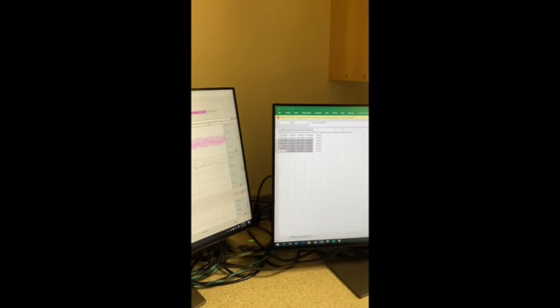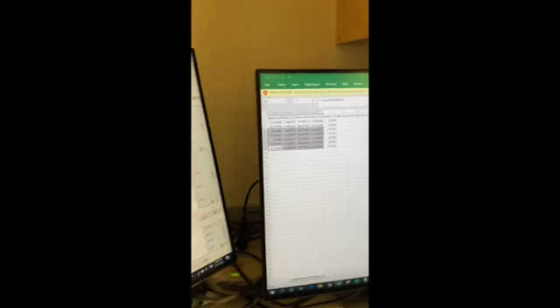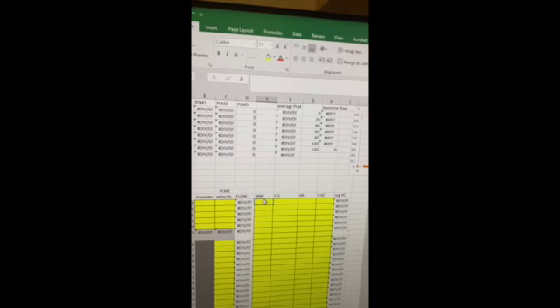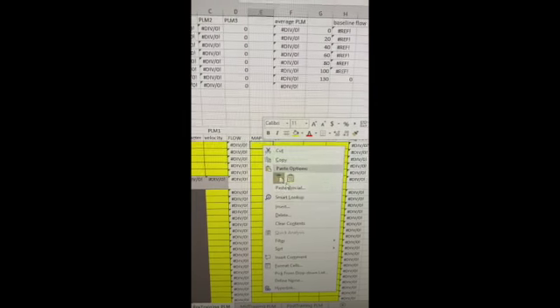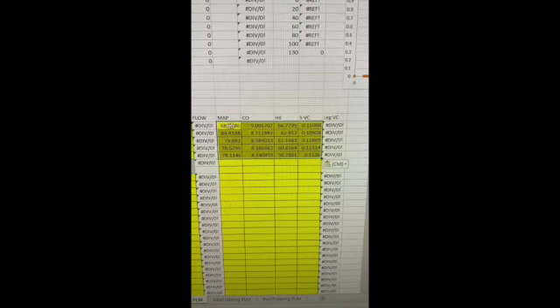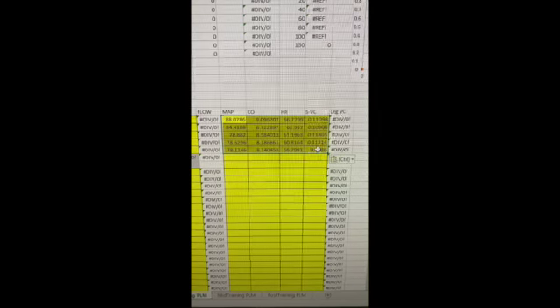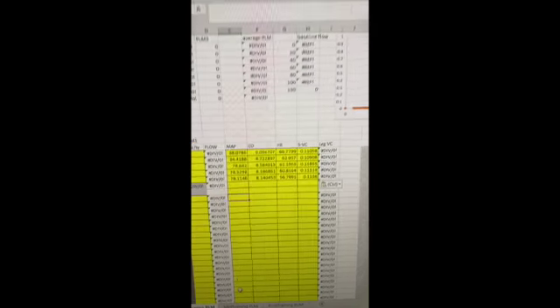Copy and paste into the Excel spreadsheet. So on this we'll do right click, and then we will paste using this icon, match destination formatting, and that gives us those beautiful values right there. And now we can proceed with the rest of the PLM. We did baseline, so let's come back here.